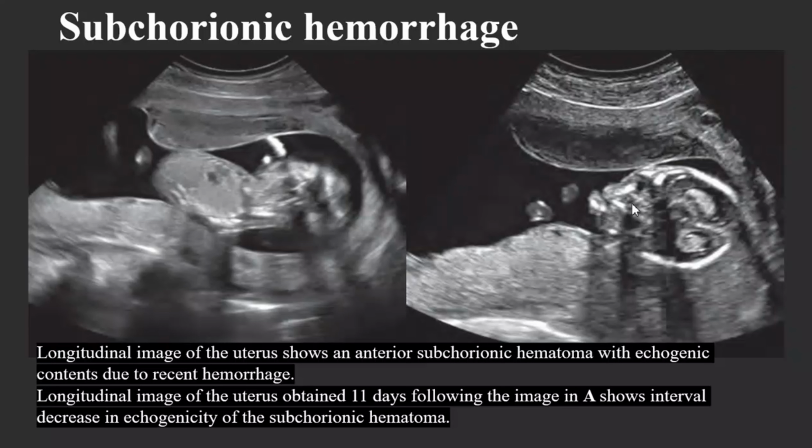And here we can see the longitudinal image of the uterus, which was obtained 11 days following this image, and it shows the decrease in the echogenicity of the subchorionic hematoma.